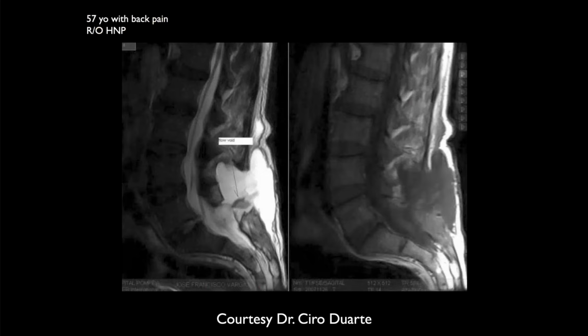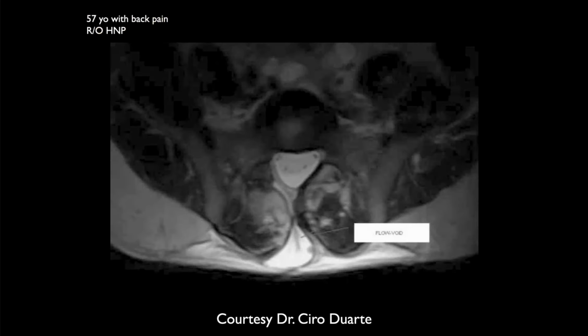All right. The back pain case. So it looks like we have a defect there in the posterior aspect of the cord with fluid extending into the, well, the cord is up here, the spinal canal. Okay, spinal canal, we see a little flow void there. This patient had surgery, and we can see a kind of a flow void going back here into this fluid collection.